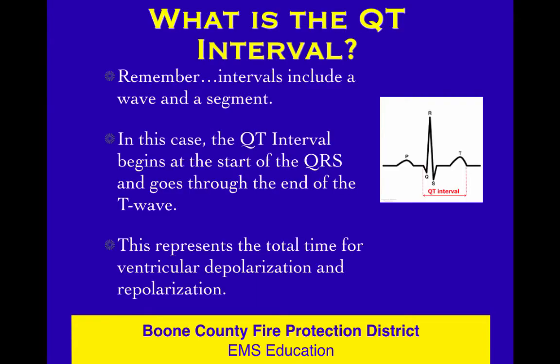Now, what is the QT interval? Well, basically it is the total time for ventricular depolarization and repolarization, which I think just kind of makes sense, that you would want to know if the ventricles are having trouble, if they're taking too long to depolarize and then reset. That would be of interest.